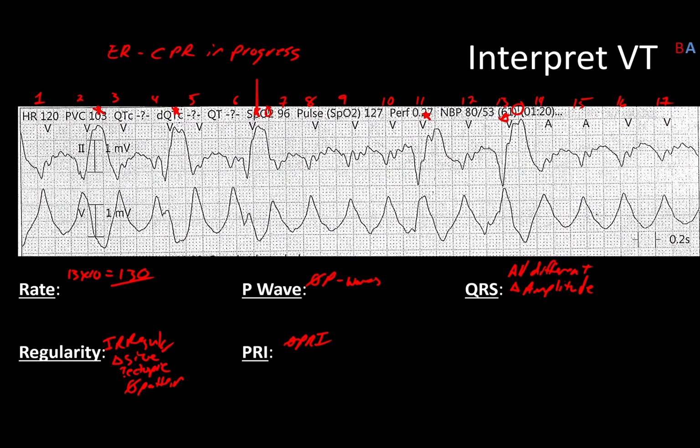If we're going to try to measure how wide the QRSs are, it's going to be a heck of a trick, because you really can't tell where they start and where they begin on this kind of strip. But we've got these larger, more strangely shaped ones, so let's try beat number 11.